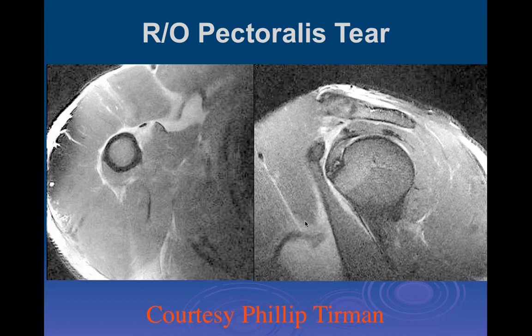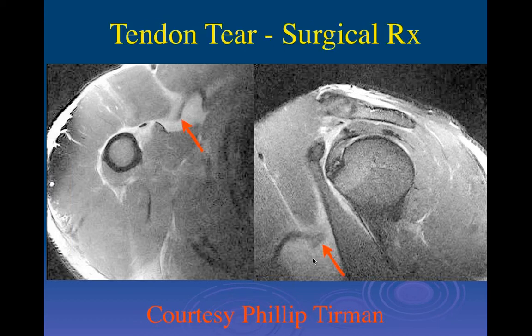And then here on the oblique sagittal images, this is the biceps muscle. This is that distal tendon that's pulled out and waving in the breeze of the tissues and the hematoma around it. So, Aram, is this a reasonable surgical case or non-surgical? Yeah, given that it's a tendon disruption, I'd say this is surgical. And it was treated by surgery.